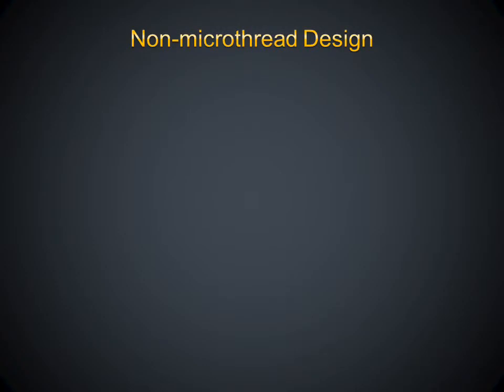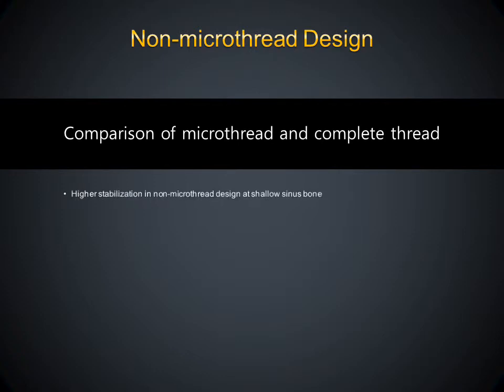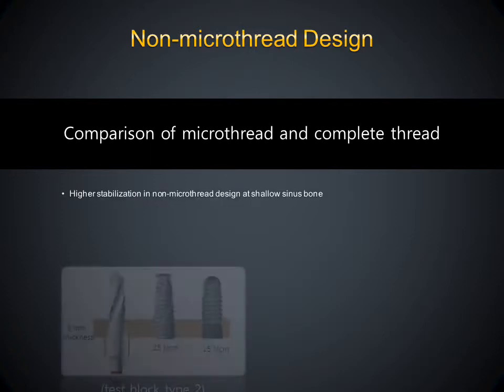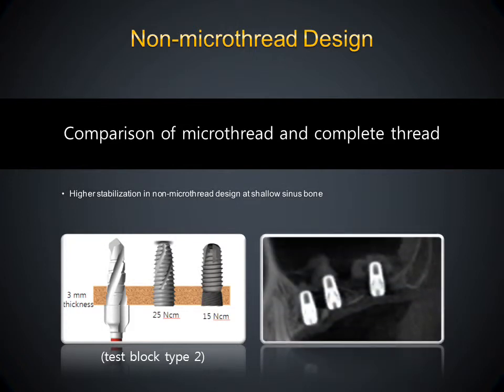Submerged internal connection implant is classified into microthread and non-microthread design according to the Crestal thread shape. The advantage of microthread design is thicker wall in the connection portion than non-microthreads. The disadvantage of microthread design is lower stability in shallow sinus site than non-microthreads.